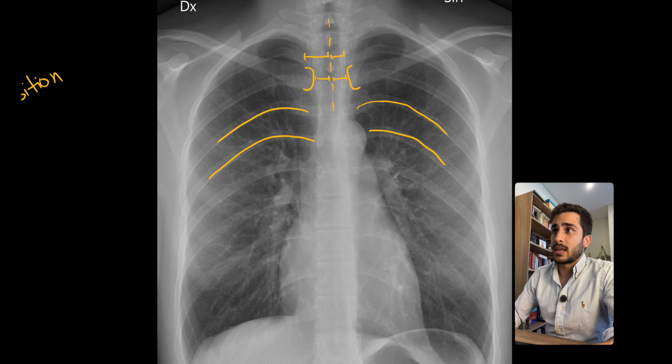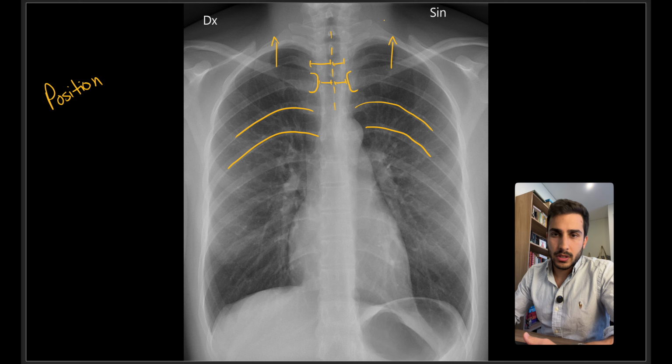The next question is, is the patient tilted left or right? And for that, the best way I've found is to look at the X-ray almost with squinted eyes, looking at the lungs to see if it is rotated in any one direction. And in this case, it doesn't really look like it is. The patient's apices of the lungs are pointing straight up in both areas, and there's not much of a tilt in each area. So all good in those regards.